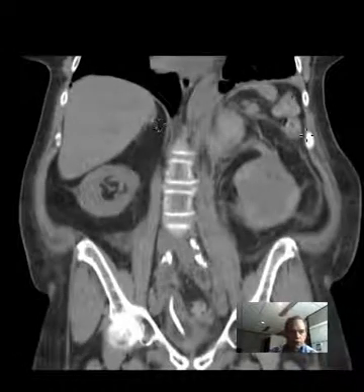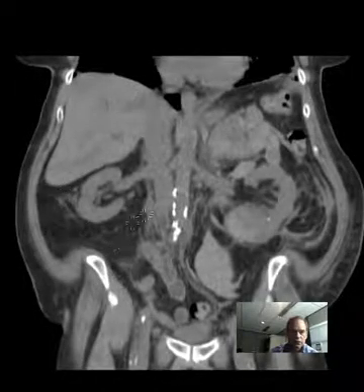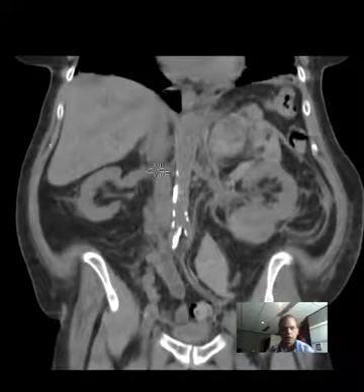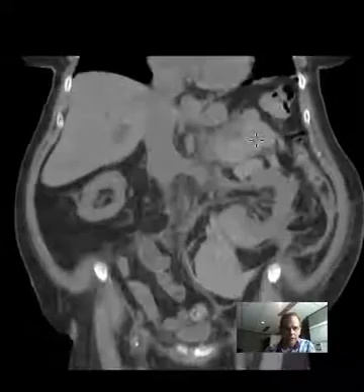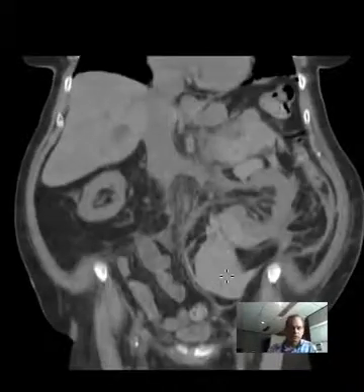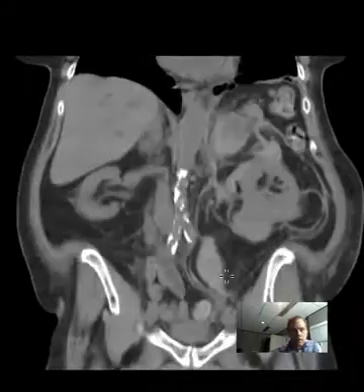This shows you that hematoma very nicely, again in the perirenal space, and look what it's done to the perirenal space. Even though it's a very small space, it varies from patient to patient, but even in this case you can see it's sitting here quietly. You'd never think there was much to that anatomy, but you blow up an adrenal gland like this, and sure enough you get all this stranding and high attenuation and enlargement, and whoa, we got a big part of the hematoma down here too. So this is an unusually large, actively bleeding adrenal gland hemorrhage.